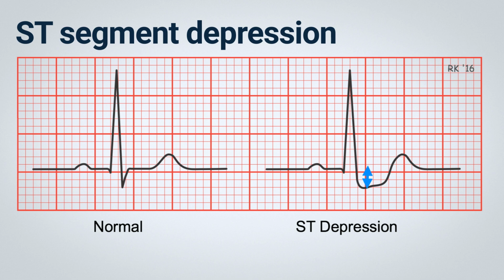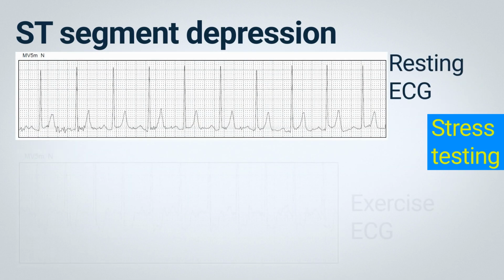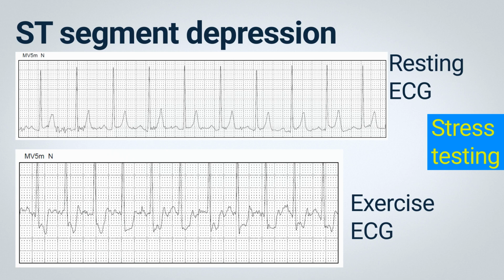Angina pectoris, a symptom of coronary artery disease, is experienced as a dull, burning or boring substernal pressure or heaviness. Many patients with classic angina have an ECG pattern of subendocardial ischemia with ST segment depressions seen during an attack, but not all. Exercise or stress testing can be used to diagnose coronary artery disease by recording the ECG while the patient is being exercised under controlled conditions. Subendocardial ischemia often produces ST segment depressions in multiple leads.